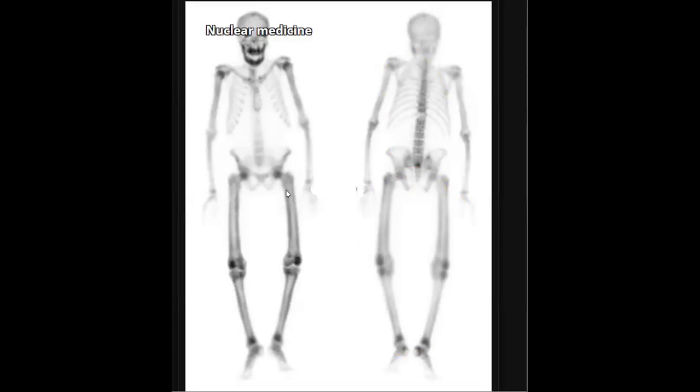And you can see here that the tracer uptake is more in the appendicular skeleton, which goes with a metabolic super scan. But two things: you have to check the activity, and you check the skull and mandible. In such a case, again, you will say, I will correlate with the conventional images.